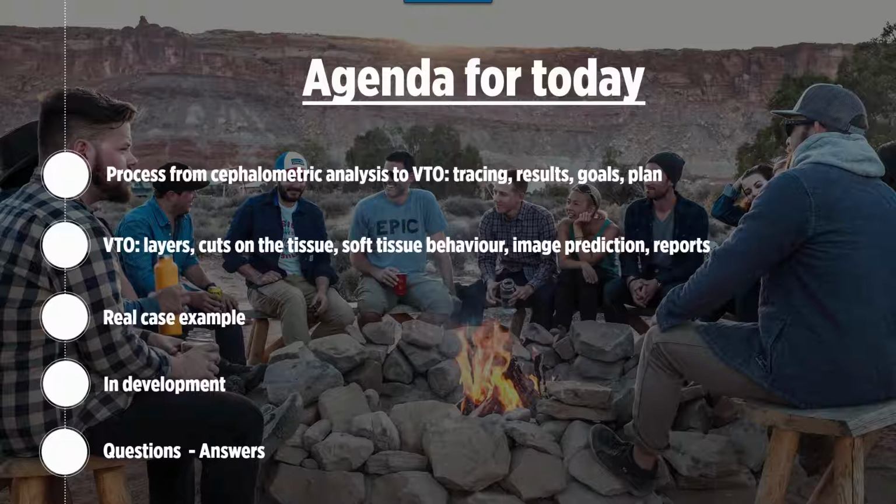I would like to reintroduce the webinar agenda before going on. First, we will cover the process from an analysis to VTO, so how everything is done. We will explain how to work inside the VTO environment, what tools are available, and will help you when you create plan, prediction and simulation.